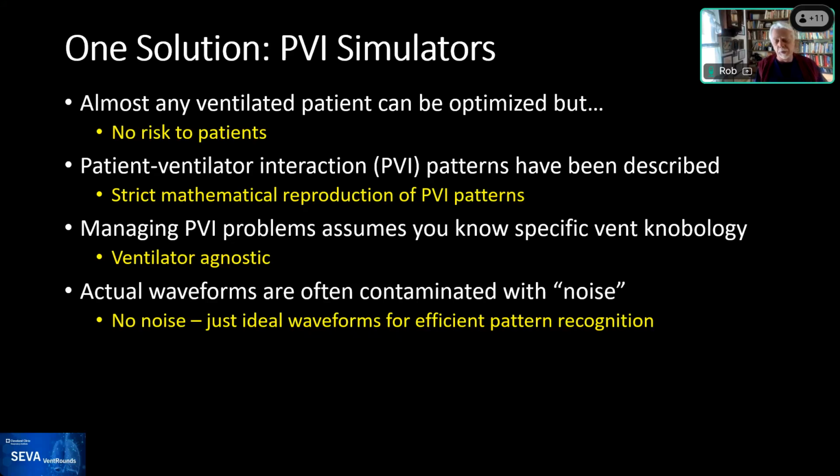They're simple pressure, volume, and flow waveforms and simple controls for pressure control and volume control settings, and simple settings for the patient, underlying patient conditions, which we'll talk about in a little bit. And again, as I said, with simulations, there's no noise. You get the same breath shape for every single breath in the pattern, unless you specifically program the simulator to do something different.